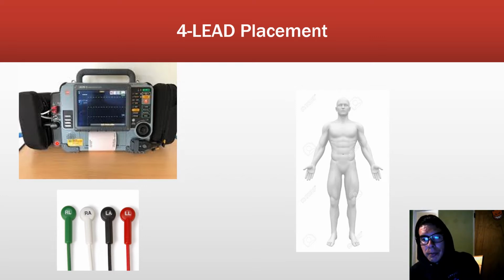But just to go over it real briefly, over here is where you have your defibrillation pads, because this is also a defibrillator. So there's little patches in there that you can stick on people. Down here is where your paper is. There's a little compartment that opens up and you can put a new roll of paper in. This little cable right there, it's one of those things that goes on your finger and it determines oxygen saturation and percentage. And then, at least on LifePak 15s, it can also identify carbon monoxide in the blood and percentage wise. Then there's an automated blood pressure cuff, which don't even get me started on.